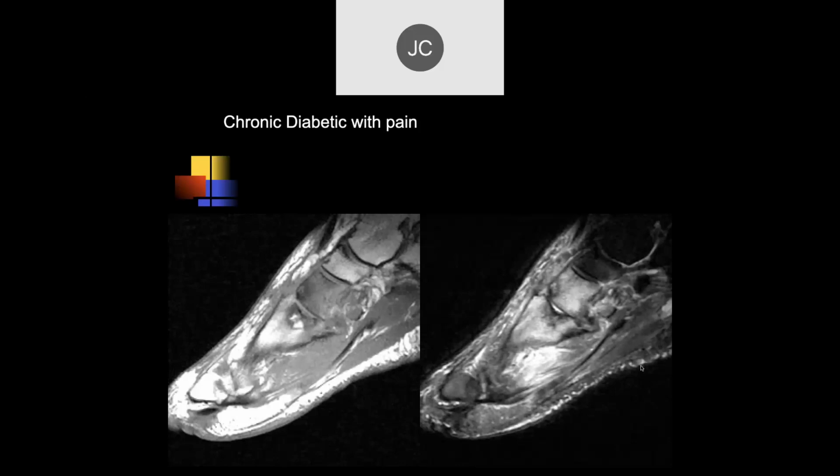It seems like Charcot arthropathy. I don't know if it's osteo here, but this subchondral cyst has relatively sharp margins. We will show examples of osteomyelitis in the next lecture when we start talking about inflammatory disease. You can get edema in the soft tissues with Charcot, but you shouldn't get abscesses.